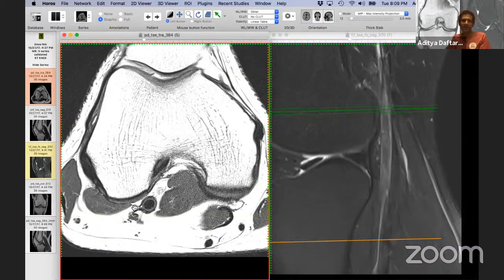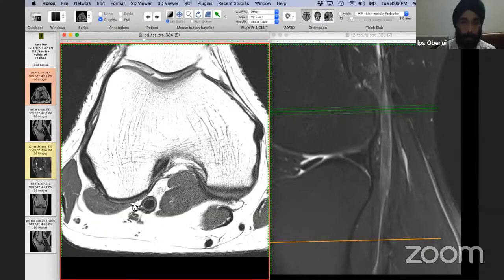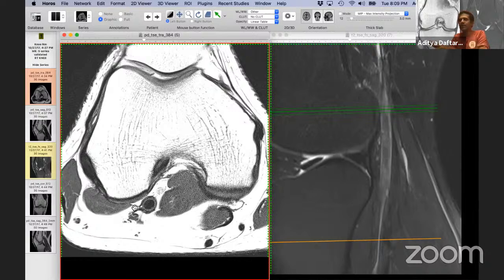So 3D MRI as a concept is essentially the phenomenon where they are now taking images with very thin sections on MRI and giving you the option to reconstruct that data. People who have been reading MRI for a while say invariably there is some loss of resolution, and they are far more comfortable reading your regular images rather than a 3D cube image.